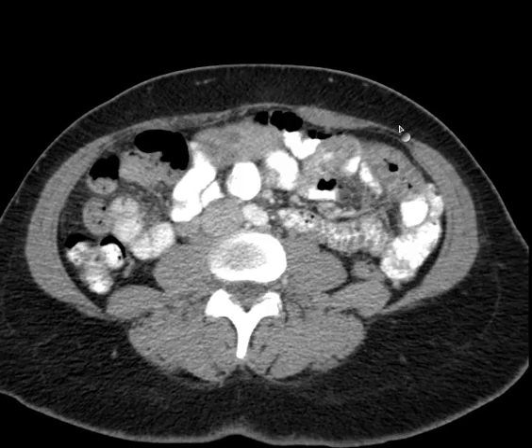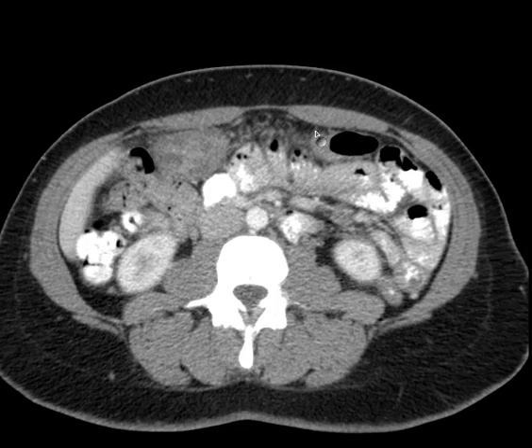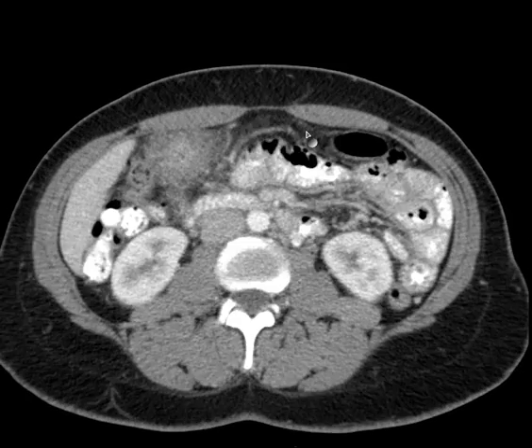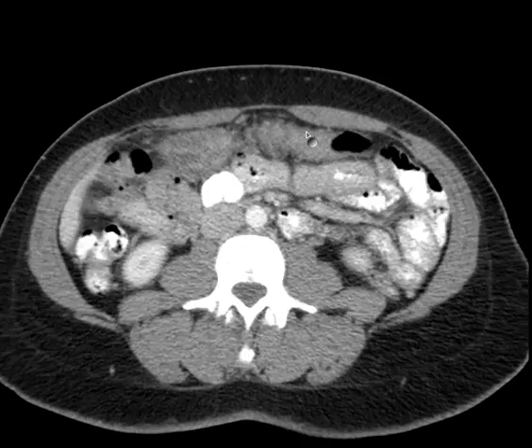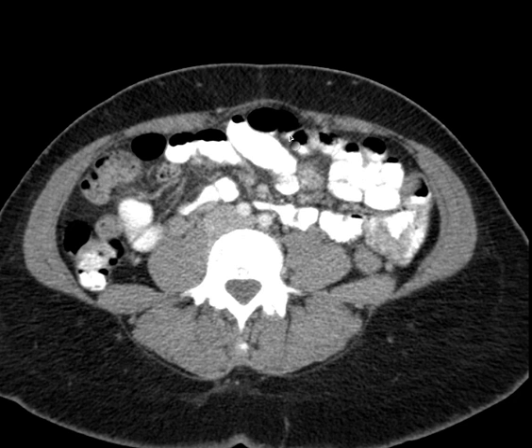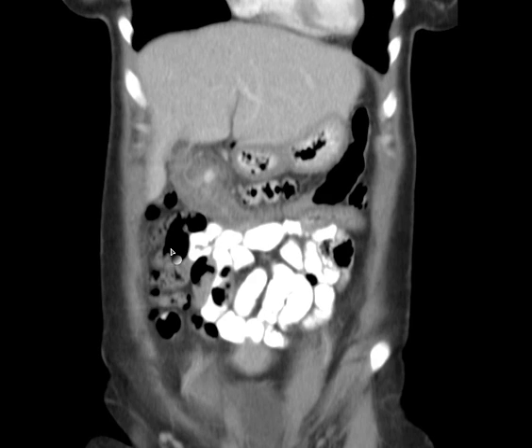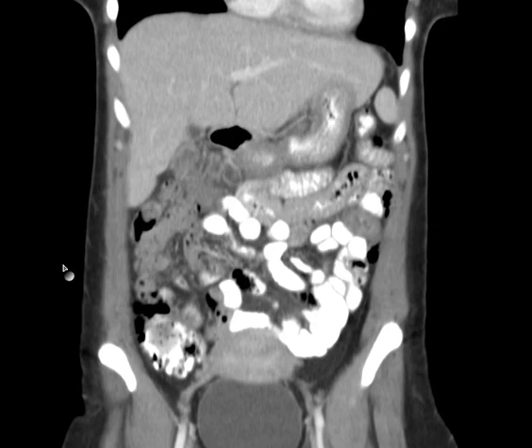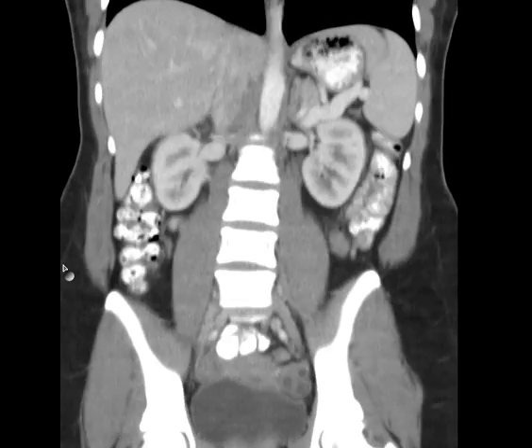But I'd like you, as I do this, to just take a look and see if you see an abnormality. And remember, once you see the abnormality, you would like to describe what anatomy is involved with that abnormality. So here we are on the coronal plane. Coronal.